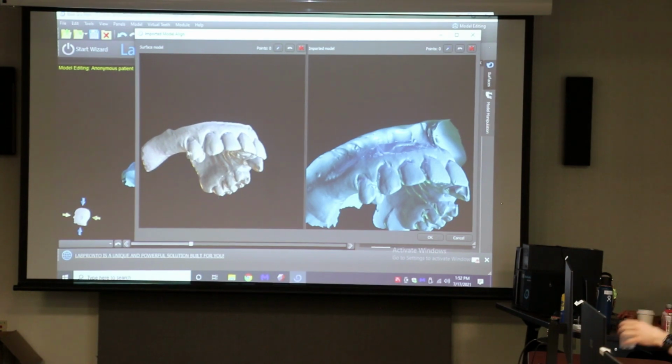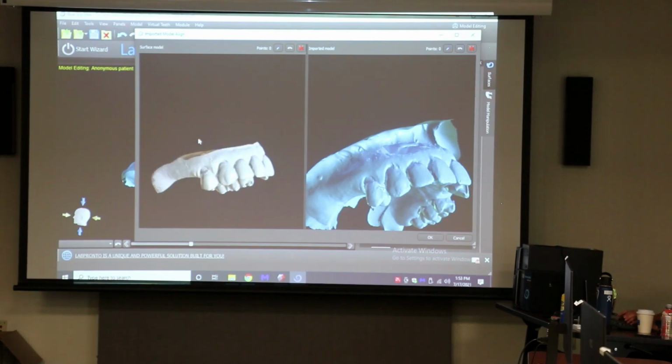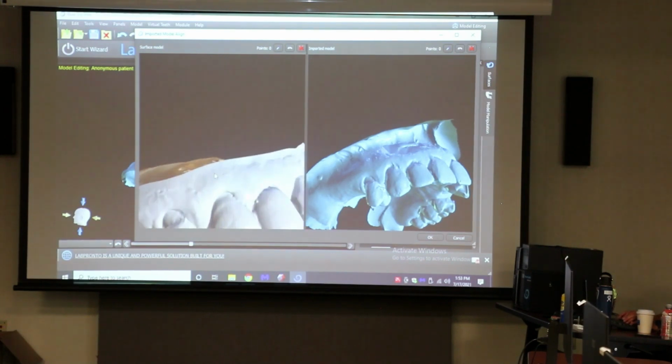It's so weird the software can be so smart when it just can't even align an STL to STL. I know. Align everything else real easy, but I know. Sorry. I know. It seems so strange.